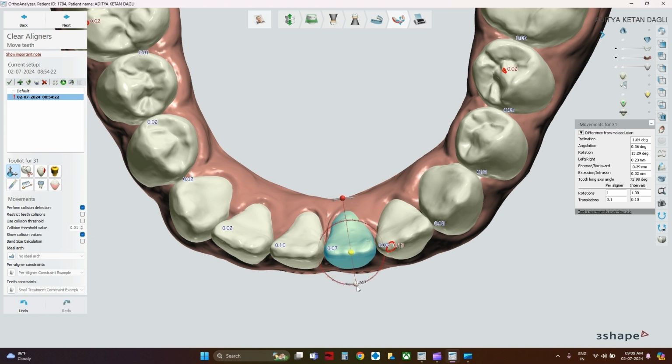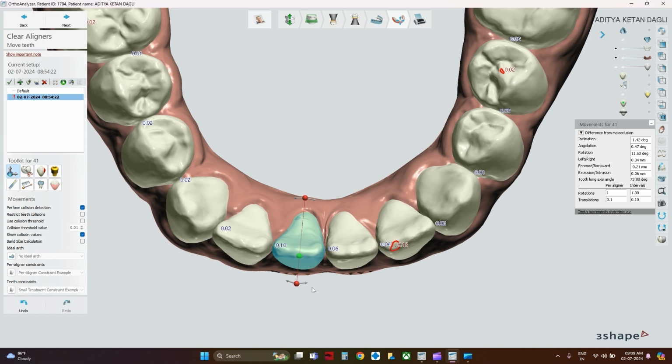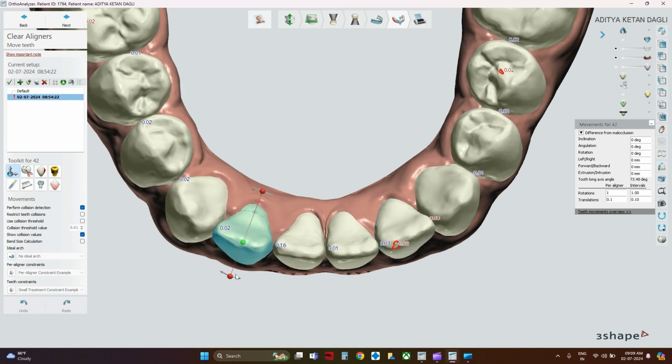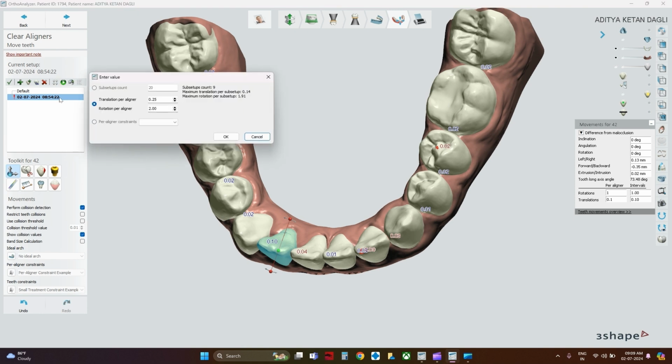All right, so if we try and incorporate some amount of overcorrection factor over here, it wouldn't be a bad idea actually. All right, so let's do that and let's push this a little bit in. Same with this one. Let's push this also a little bit in. All right, and you can go back and check again.